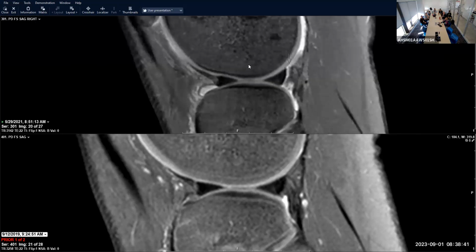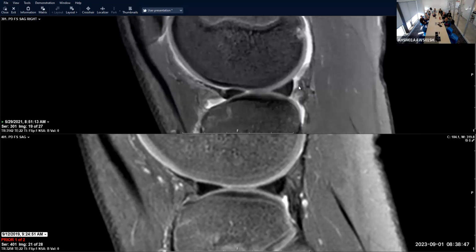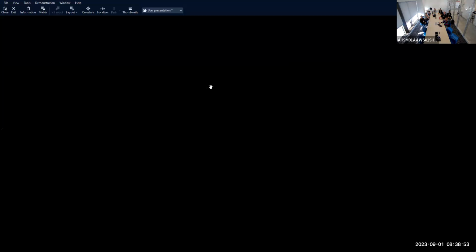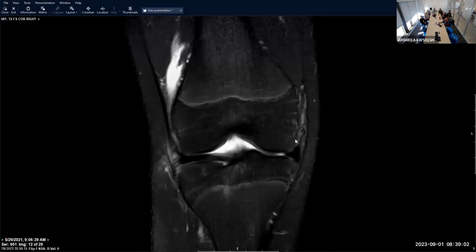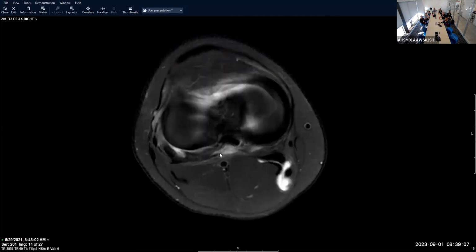In the cases when it's not adding up, I would encourage you to take another look for some of these things. One of those would be meniscocapsular separations, posterior horn, lateral meniscus. We see it sometimes. One of the things that was freaking me out is that there's all this soft tissue edema here, which I didn't have a great explanation for. Could be a soft tissue contusion, I guess, but I just wanted to keep looking for that reason. And then you can see nicely that there's this cleft between this little piece of tissue and the normal lateral meniscus posterior horn. So I suppose there's a thin area of meniscus that was sheared off here posteriorly.